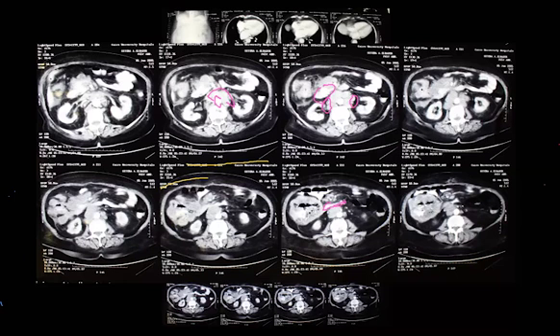But what else? What other than a metastasis? There's something important: lymphoma. Absolutely, a lymphoma. Is this a lymphoma, or other rare things. Para-aortic lymph nodes are usually generalized. Of course, I don't know. The first thing that you have to do is to look for the lymph nodes all over the body.